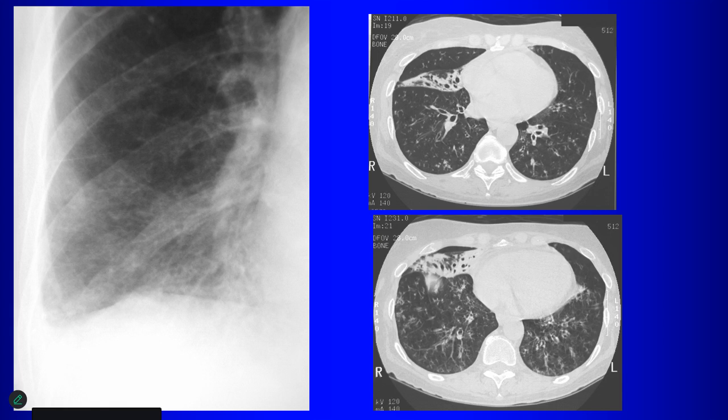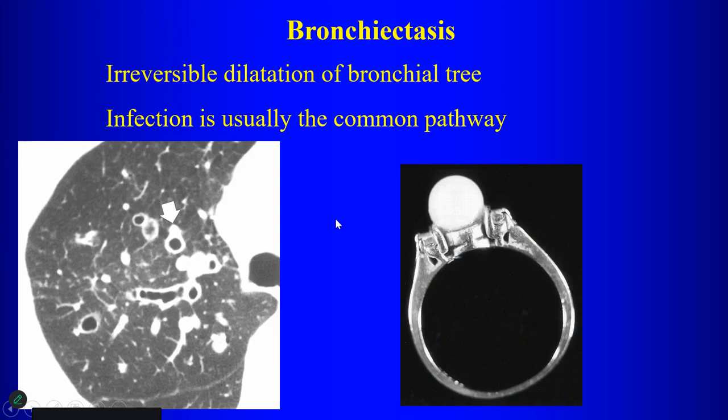Sure, that's probably one of the most common things to think about. So we have bronchiectasis in a lower lung distribution, these areas of abnormal opacity. So chronic aspiration, right? That's a very common cause of bronchiectasis, especially in a lower lung distribution. Although there are other things that can also cause bronchiectasis, but if we see this in adults, it's probably one of the most common things to come to mind.